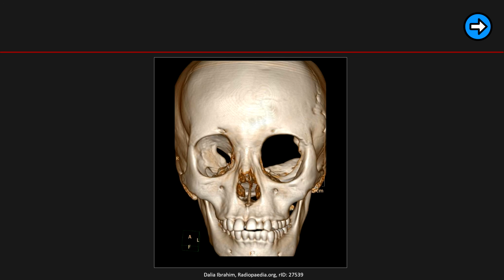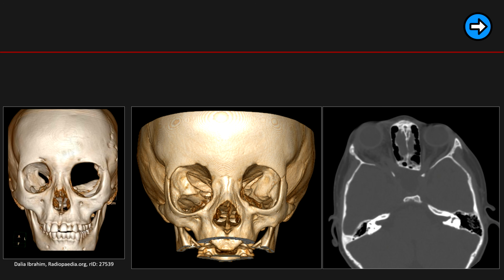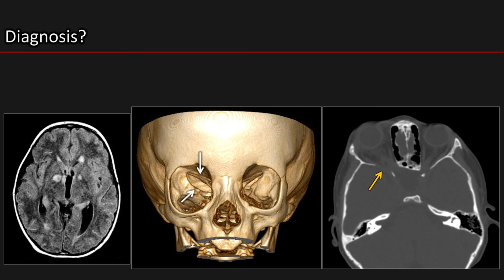This is from Radiopaedia of a particular imaging finding on the left orbit. This is our patient with the same finding, except with a less exaggerated finding compared to the Radiopaedia finding right here. With additional finding on FLAIR sequences, what's your diagnosis?